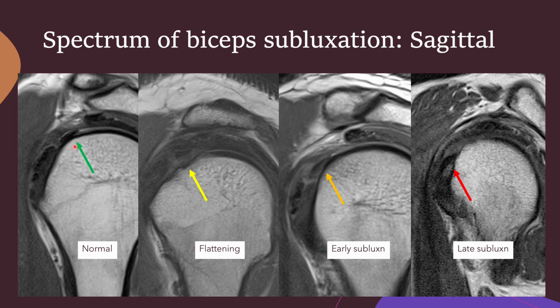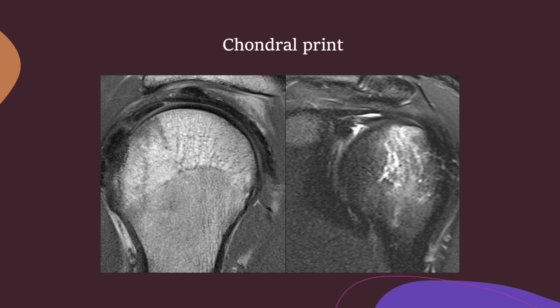Now, in our patients with instability, what you can see is this is the normal biceps tendon. You can see somebody who's got instability. You can see the biceps is more flattened, almost having a knife-like appearance. Here you can see it's subluxed inferiorly because it's cutting into the subscapularis, and here it's sort of dislocated completely into the subscapularis here. Okay, so this is a good way for you to see and identify abnormalities with the biceps at this rotator interval area.